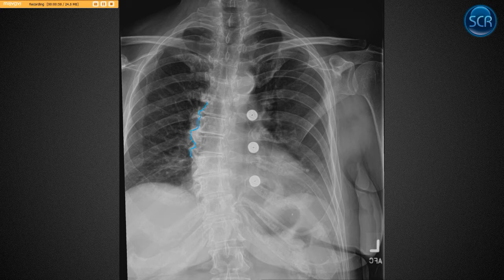Again, we have our very, very hyperplastic kind of calcification of the anterior longitudinal ligament kind of plastered along the right side of the vertebral bodies. It's not on the left because we have our aorta over here, which pulsates constantly, and that inhibits formation of calcification within the ALL on that side. And this person also has a little calcification in the wall of the aortic arch called thumbnail calcification, and extensive costochondral calcification, no one cares about that. So this is a case of DISH.